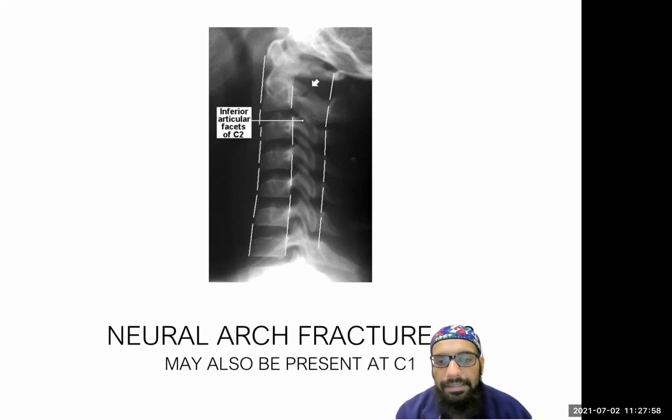The other thing is that I've often noticed people asking for swimmer's views without first looking at the normal C-spine X-ray, which you can see here. So a swimmer's view is only asked for when you don't have a good enough view on your normal C-spine.